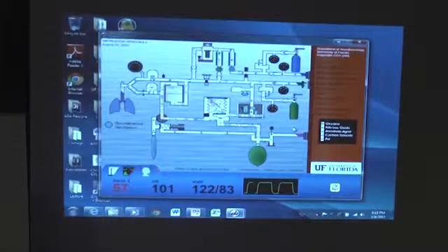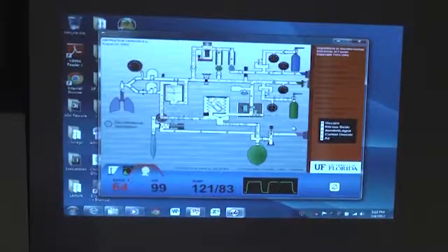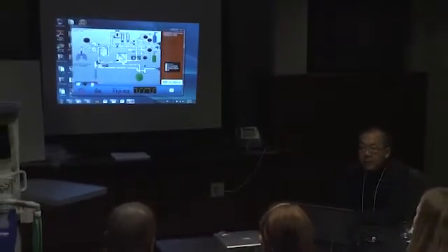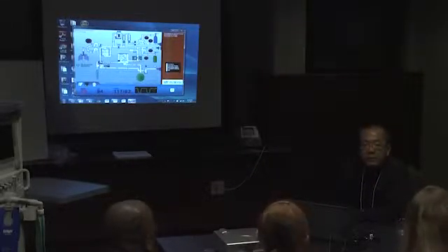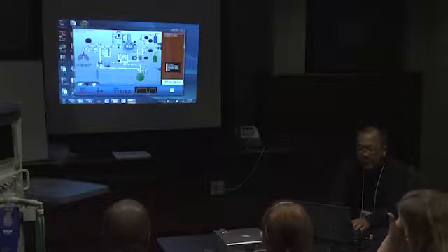But now, as you sit here, aren't you thinking, hey, hold on. There are two safety features in an anesthesia machine designed to prevent hypoxic gas delivery. What are those two features? The oxygen analyzer and the ORC, the oxygen ratio controller. It's also called a hypoxic guard, right? In this machine, how does it work?